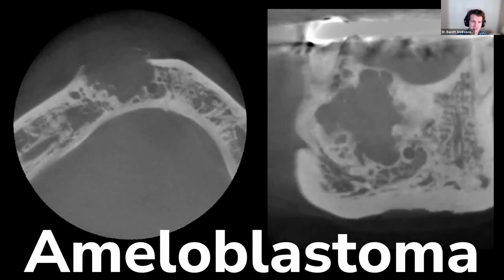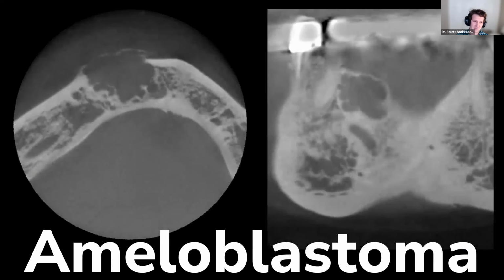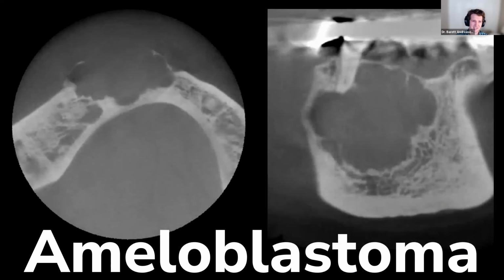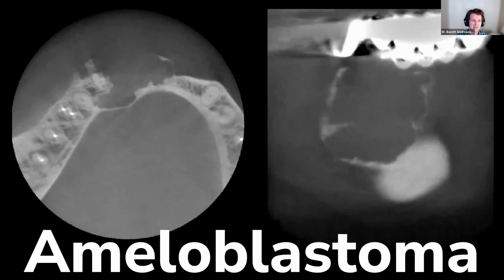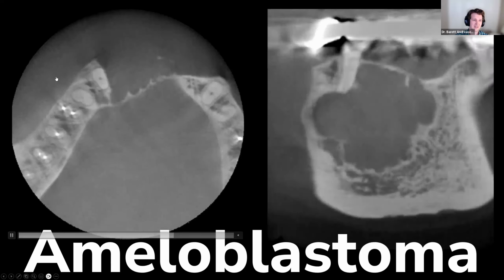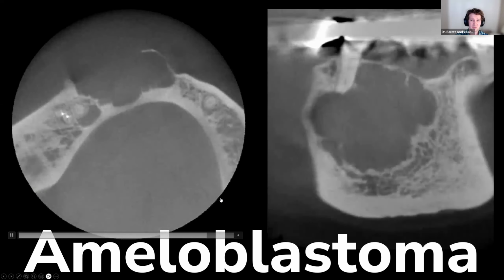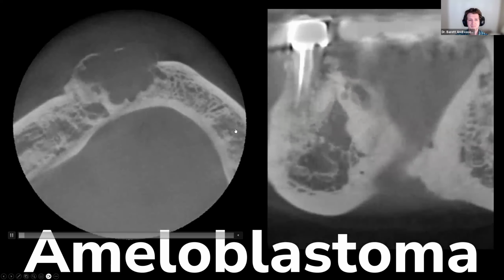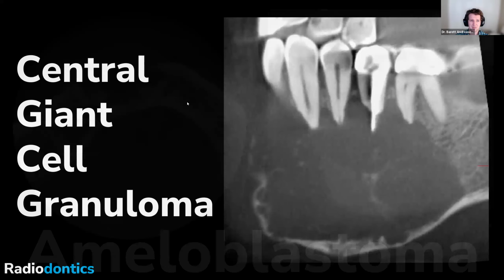Ameloblastoma, these I would consider a little bit more aggressive than odontogenic keratocysts. I guess it just depends on the specific type of ameloblastoma. There's solid, there's unicystic, and each of those have slightly different characteristics. But again, the most important thing is that you can identify them. And we can see the very classic multilocular appearance of this ameloblastoma. You can see the buccal expansion, the thinning of the cortex in this area. Very, very common to see all these features in ameloblastoma.